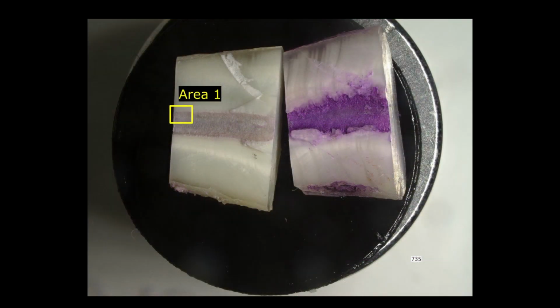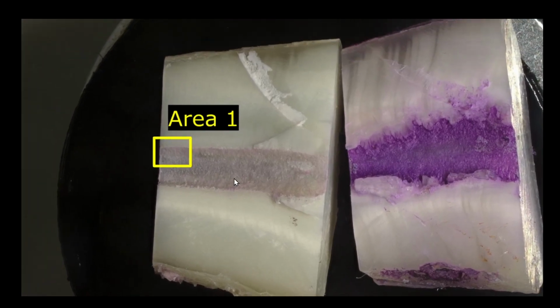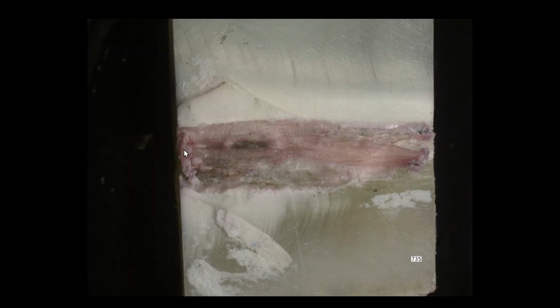When I called Pushpak and told him I couldn't find any bacteria at all, he said, I knew it, because when he tested the tooth, it tested perfectly normal to all of the pulp tests. So now I feel a little better about not finding anything. I did take some pictures of the canal area coronal to the apical segment.